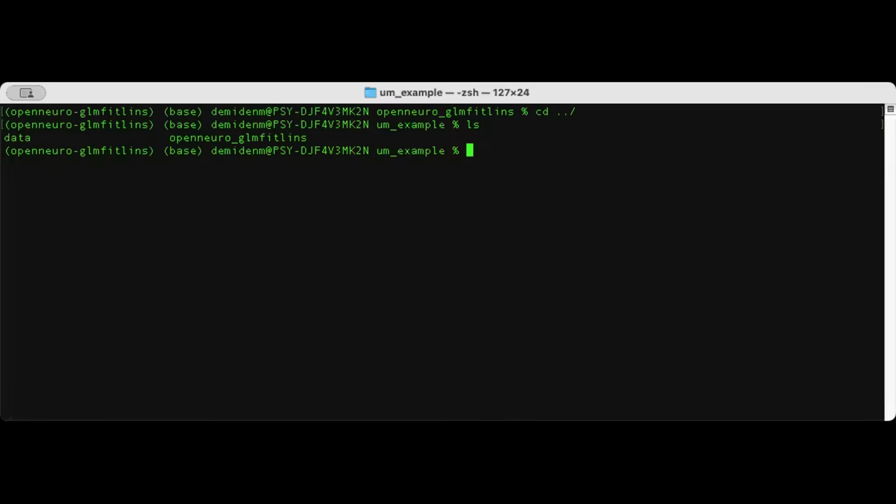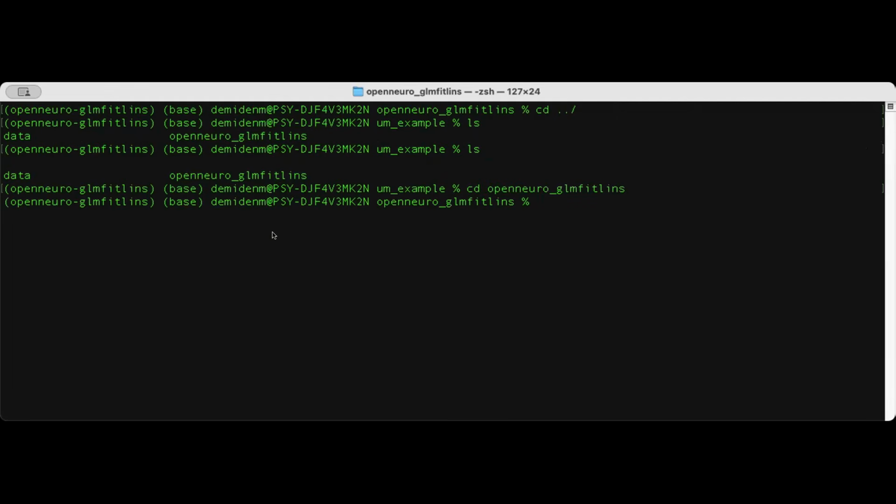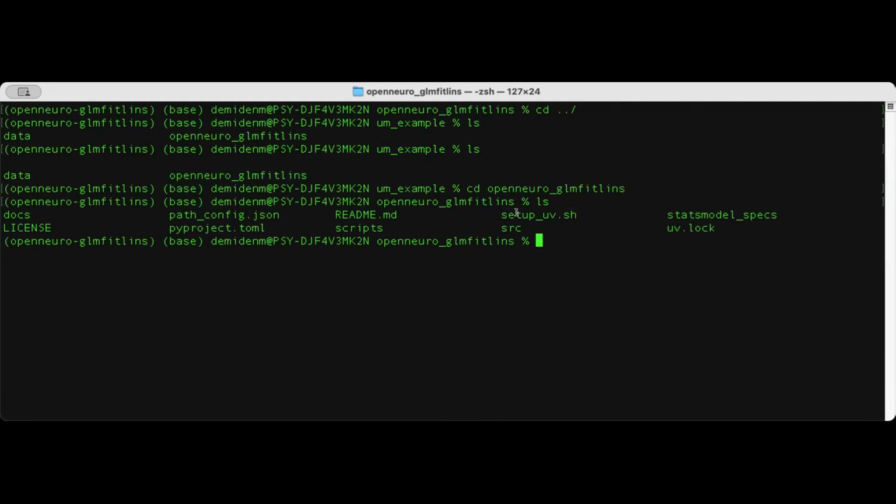All right. So I'll just go over a quick example of how this works. To use it, to start off, you would just run the clone command on GitHub. I'm not going to run it because I already have a clone. So it's in the repo, you run git clone, and once you run it, it creates this folder, and you just navigate into that folder. Once you're in the folder, there's a setup script. So we can run it. I think I've already run it before, but just run it again.